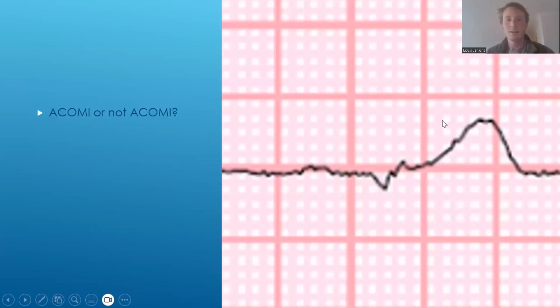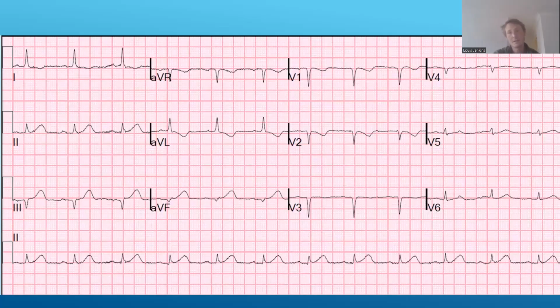But anyway, basically, if you blew up the size of the QRS complex, this T wave would look massive, is the point I was trying to get across with this slide. Okay. So would you take this patient to a cath lab? I would, I believe. Actually, I think I can take them. It's kind of funny. I can take them because of these T wave inversions, under high risk ACS.